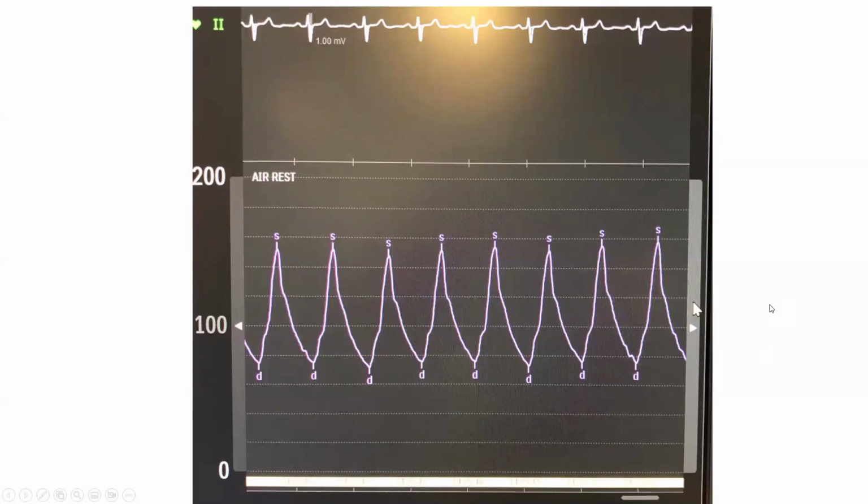Note that a patient with severe AI may also have an anacrotic notch, because severe AI can create a functional AS, especially when severe AI is associated with mild to moderate AS. That aortic hole in systole is functionally obstructive for the high flow that is recrossing that aortic valve. So you get a functional AS and you get an anacrotic notch, except when you have a predominant AI with some AS or with functional AS, that anacrotic notch will be high lying, up on that waveform, not so much down. That's why this is predominantly severe AS with either some degree of AI or non-compliant peripheral arteries.